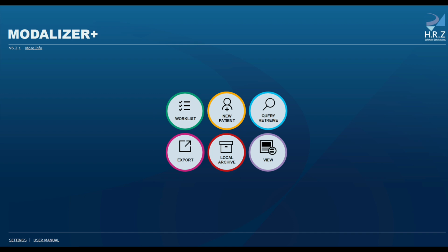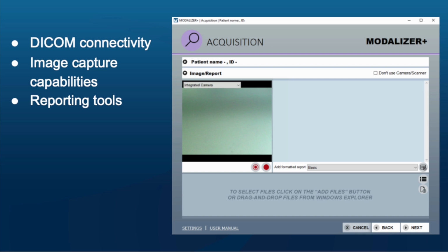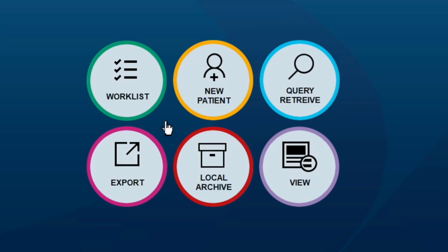MODALIZER Plus turns your PC into a medical imaging modality, adding DICOM connectivity, image capture capabilities, and reporting tools. MODALIZER Plus is also a DICOM converter, capable of DICOMizing images, videos, and PDF documents. It is very versatile yet easy to use software.